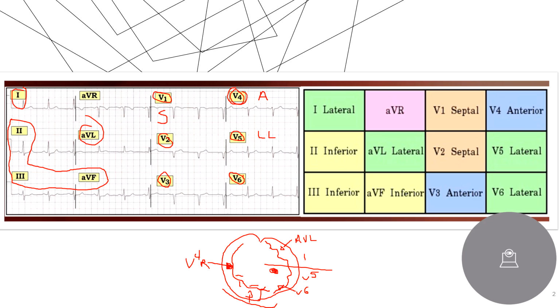All right, like I said, I don't care how you break it down, as long as you do it consistently. If you look septum first, anterior first, I don't care. Some people like to look at inferior wall first and then anterior. It doesn't matter. Just do it consistently, break it down, and know where you're looking.